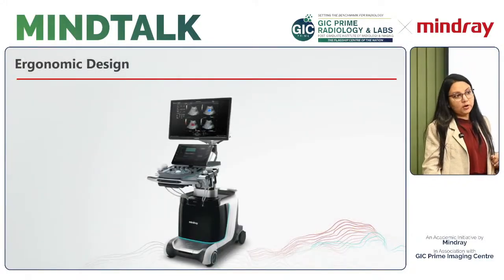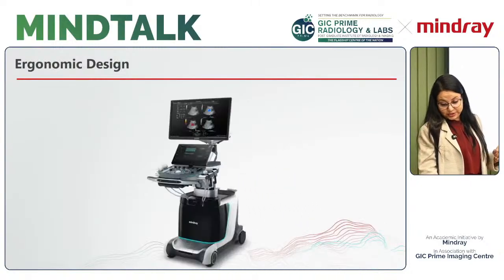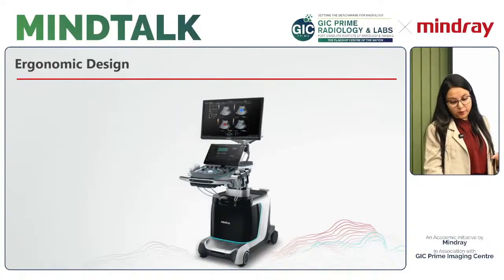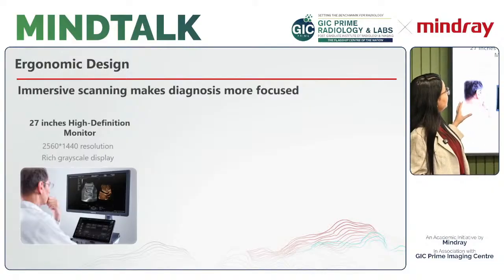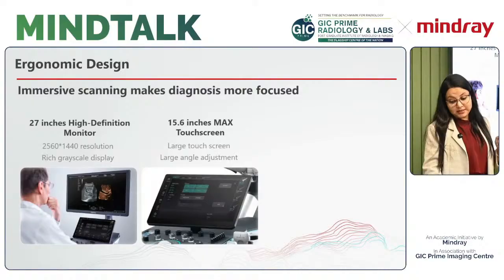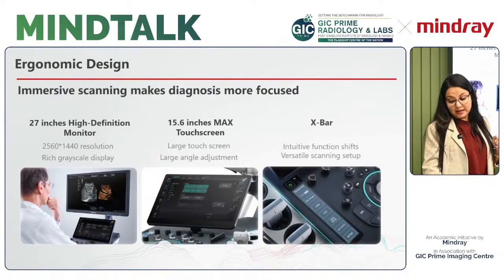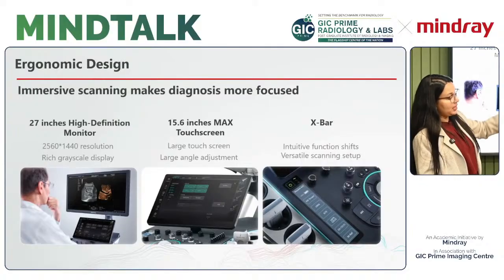And when I talk about the ergonomics, this is how the machine looks like, very robust and very impressive, with a very big monitor, 27 inch high resolution monitor, 15.6 inch touch panel, and there is an X bar which gives you direct touch to the applications.